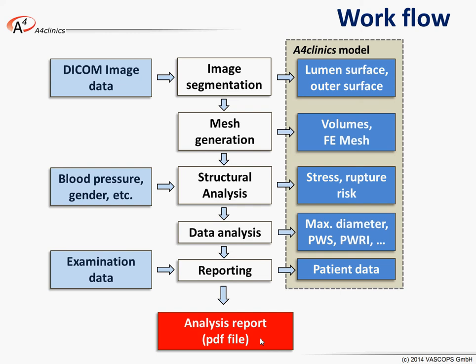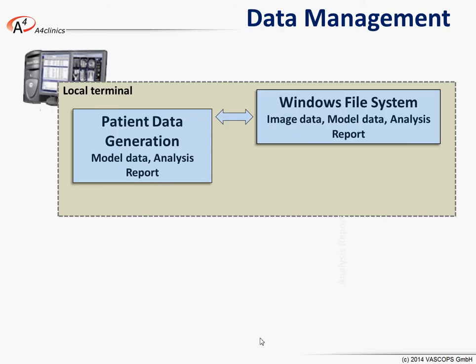Now that's the basic workflow to perform this type of analysis, and now let's see how the system is integrated into the clinics. All the calculations take place on a local terminal. So there you're going to derive your patient data, risk indices, volume measurements, and so forth. If you just use the plain software, you can use the Windows file system to store your data.